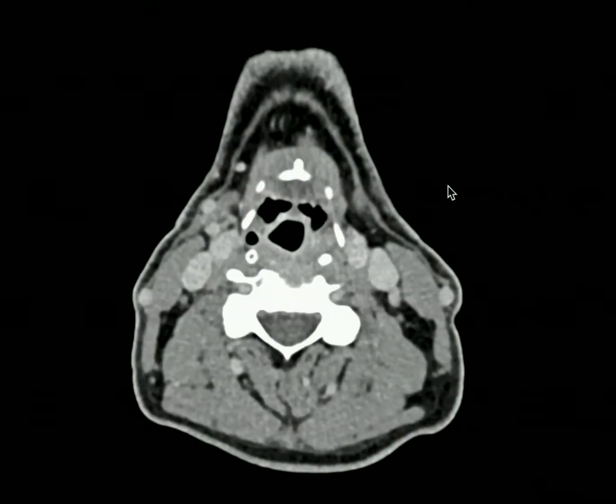We've now returned to our axial CT images, and we'll now use this image set to discuss the hypopharynx subsites. The hypopharynx subsites are the piriform sinuses, the posterior wall, and the postcricoid region. First, the piriform sinuses. These are shaped like inverted pyramids with their bases up here at this level of the lateral glossoepiglottic folds. These are also known as the pharyngoepiglottic folds.